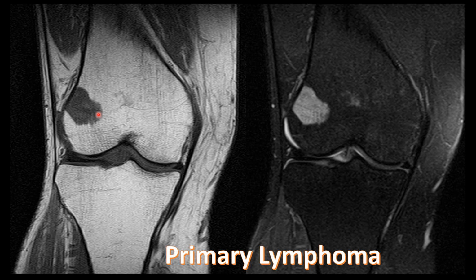So it's usually an invisible lesion because it doesn't destroy the trabecula on radiographs. You can barely see it on CT, it's avid on PET, and it's very obvious on MRI, but does not destroy the trabecula. Just think about lymphoma, for example, of the kidney and pancreas that would enlarge the organs without actually causing any disruption to the form of the organs itself. And in the bone, they grow around the trabecula without destroying them.